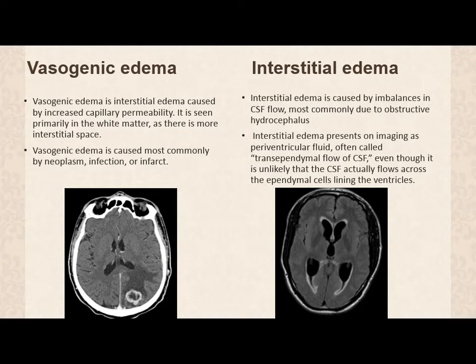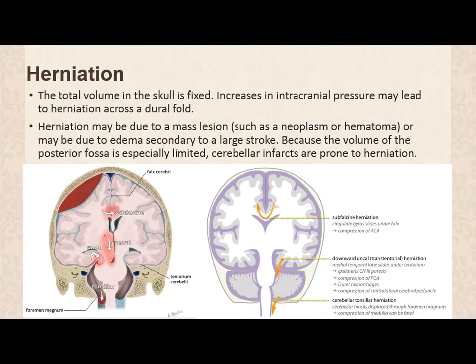Okay, while interstitial edema is due to increased CSF pressure. When the CSF pressure in the ventricles is higher than usual, it will start flowing through the ependyma into the brain, resulting in these hyperintense areas in the ependymal layer of the ventricle. This is called increased transependymal flow. What does that mean? It means there is active hydrocephalus. There is hydrocephalus with high pressure. Active hydrocephalus.